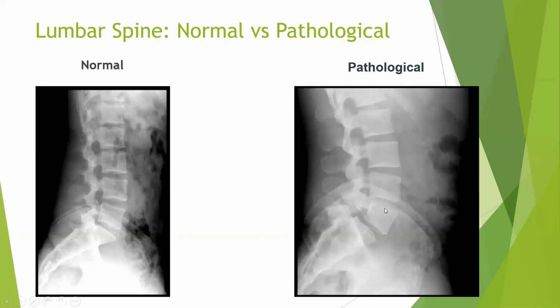And in this pathological X-ray, the intervertebral disc height is narrowed between L4, L5 and L5, S1. The foramina is also narrowed or shortened between L4, L5 and L5, S1. So these two things are very evident because there is a listhesis of L5 over S1.